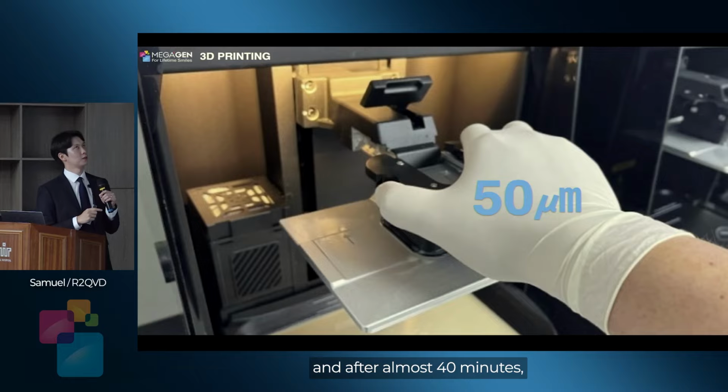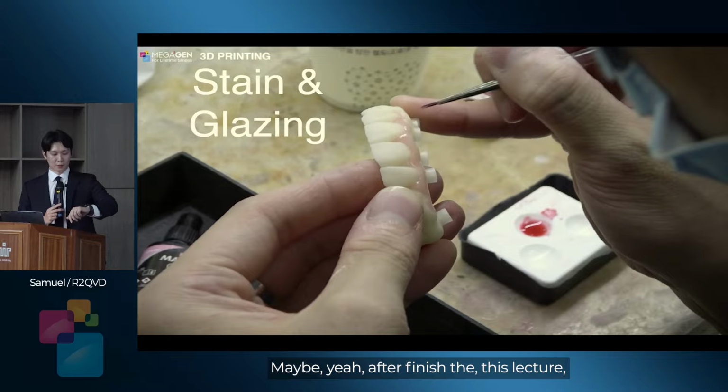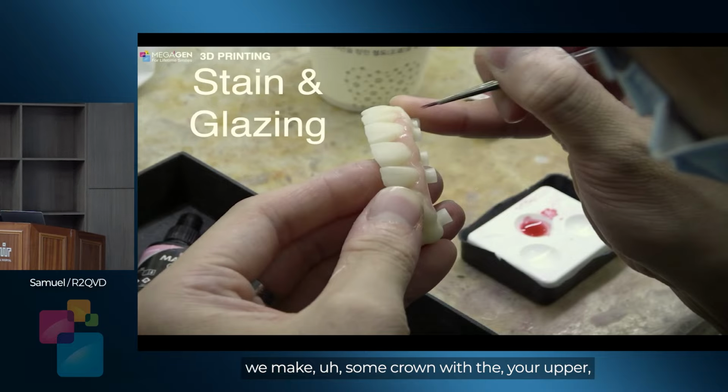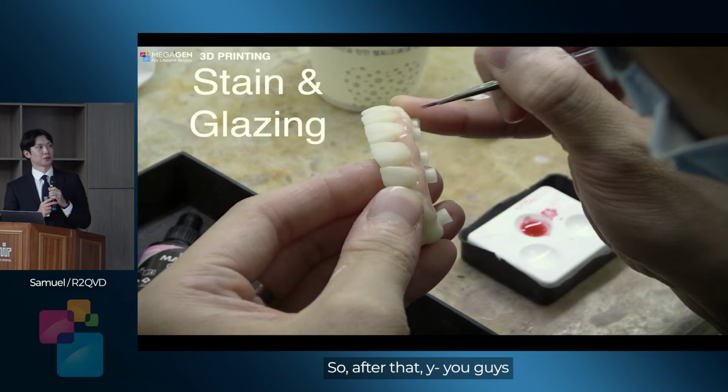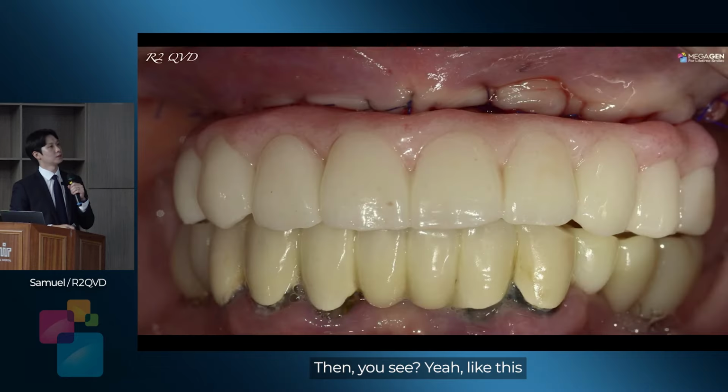And after almost 40 minutes, we get the crown, and using the glazing, we do like this. Maybe after finishing this lecture, for some of you, we will make some crowns with your upper jaw surgery. So after that, you guys can check with the screw. Then you see, like this.